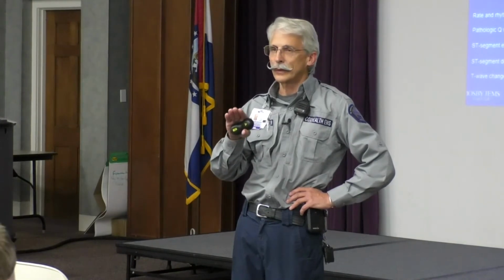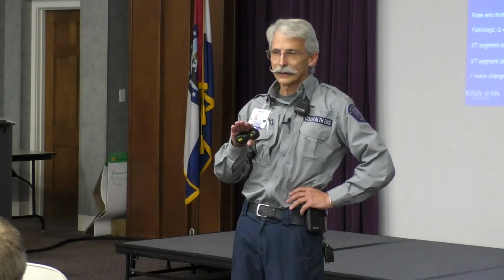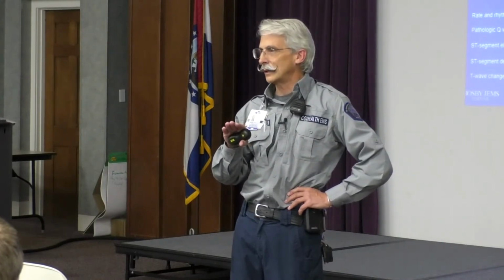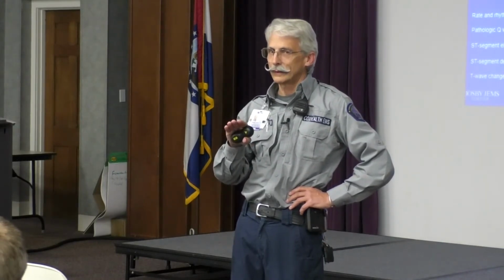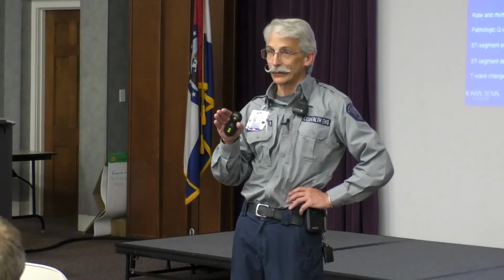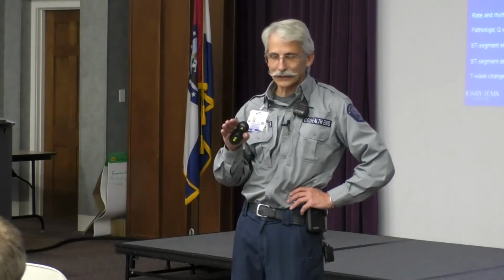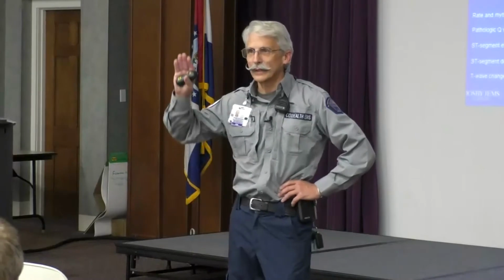When you're talking on the radio about this stuff, don't say that I have elevation in 1 through 4, because they're going to go, well, you're nuts, because leads 1, 2, 3 are okay, but there is no lead 4. But there is V. There's V's. Who knows what the V stands for? Vector? Nope. Ventricular? Nope.